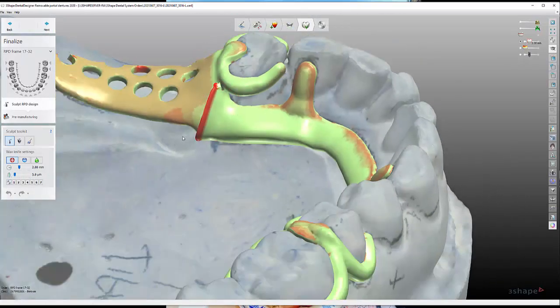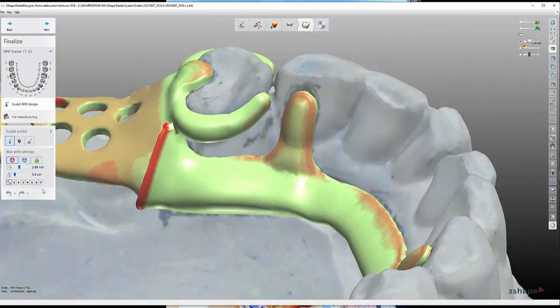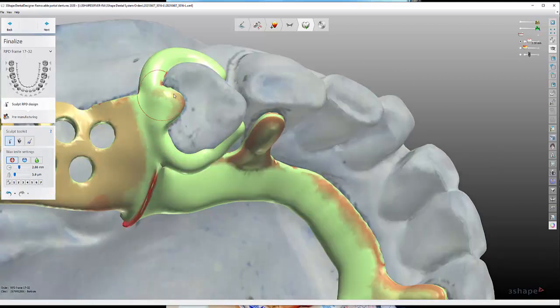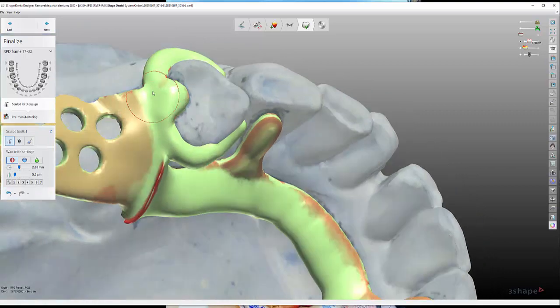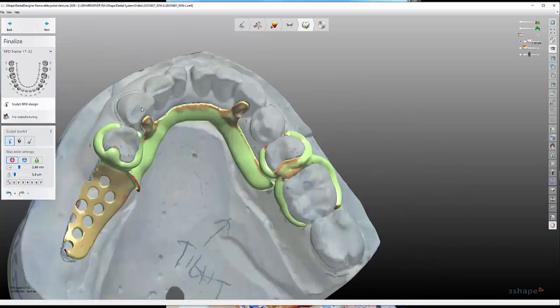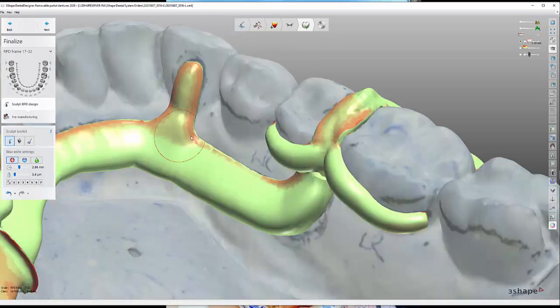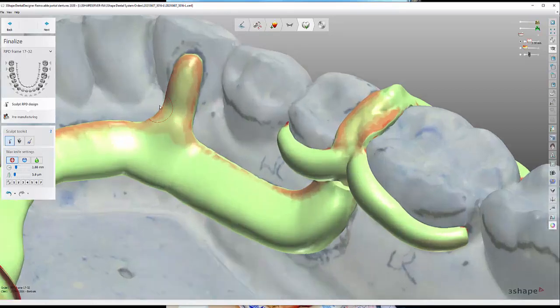So when I do my sculpting here, I'm using a very low amount of wax. Sorry about the phone in the background here. Got a phone call. So just a little bit of blending right there. A little more right here in this, I'll say low spot.